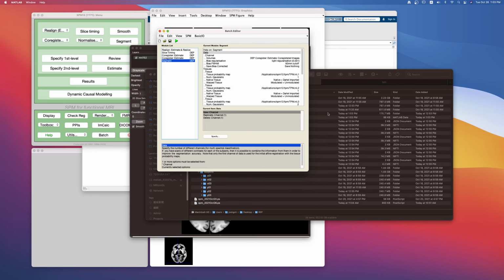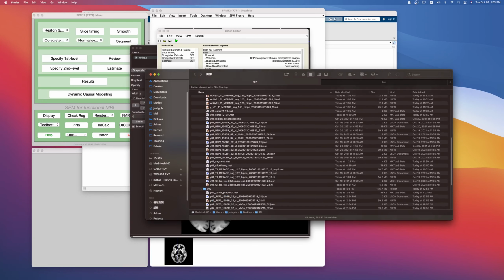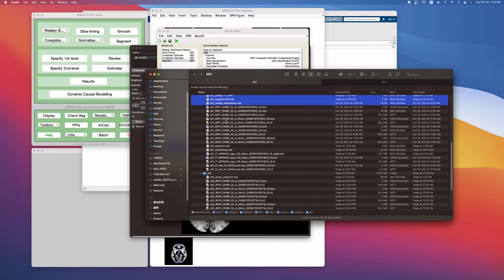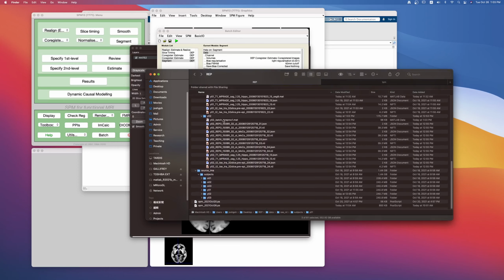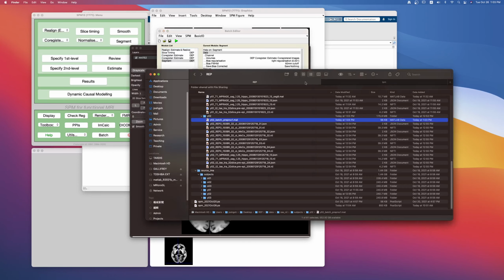So now we have a batch preproc, which is the summary of all the different preprocessing batches that we did for Y01. We combined them into this one big one in Y02, and we tweaked things a little so that it would operate on Y02 files rather than on Y01 files. Once this is done, you can very easily just click play, and SPM will run through all of these sequences. Then you can take a break and come back in about 15-20 minutes, depending on the speed of your computer, and all the Y02 files should be processed as well.